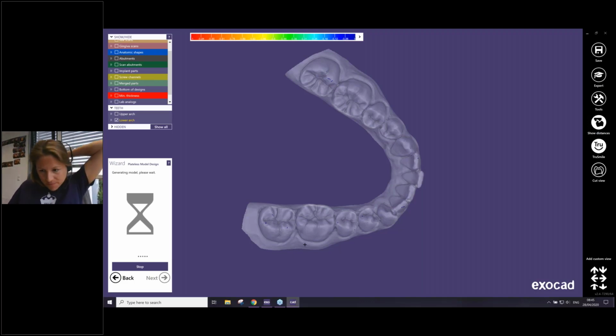Sorry, during the calculation, did you explain this lab analog offset or not yet? Yes, I have shown that you have this value. Okay, thank you. But it's only available since Plovdiv. Before with Matera or Valletta, it was not possible to have this value. And with the Plovdiv release, the lab analog offset gap parameter is always available. Okay. Any other questions so far during the calculation?